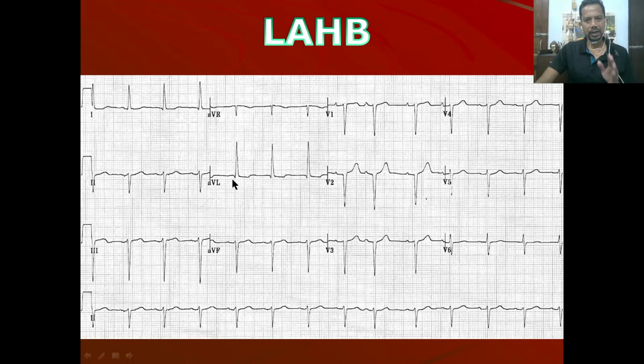Now I told you LBBB and LAHB are usually organic blocks. The patient has CAD in that case. Now you look at the R waves, small r, no progression, V3 no R, V4 no R, hardly any R. Okay, so old anteroseptal MI.